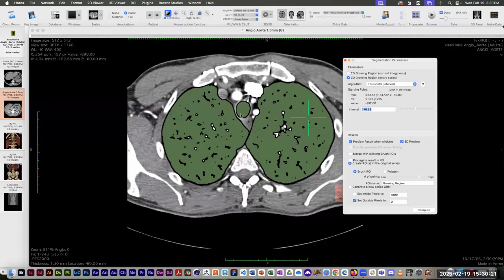It's also filled in the trachea, which in this case happens to be round, and it's extended that over to the other lung. So, I don't know exactly what number to set here. I have a feeling I can also set it too high. Like if I click way up there, it's still, the green is limited to just the lungs and the trachea. So it seems like it's hard to set it too high, again because the lungs are so black. They're so distinct from everything around them.